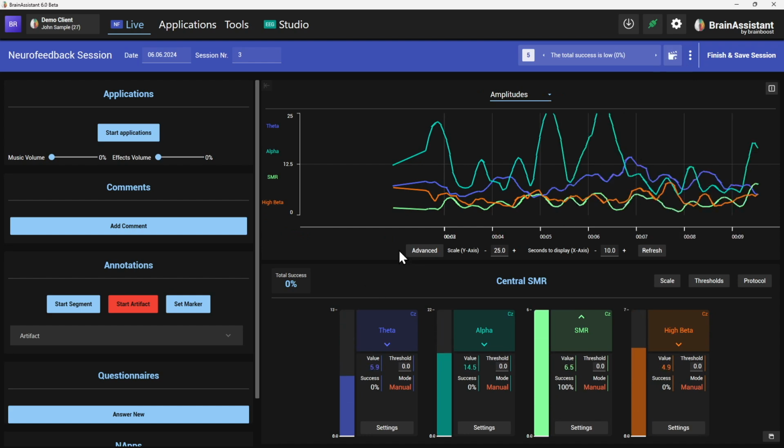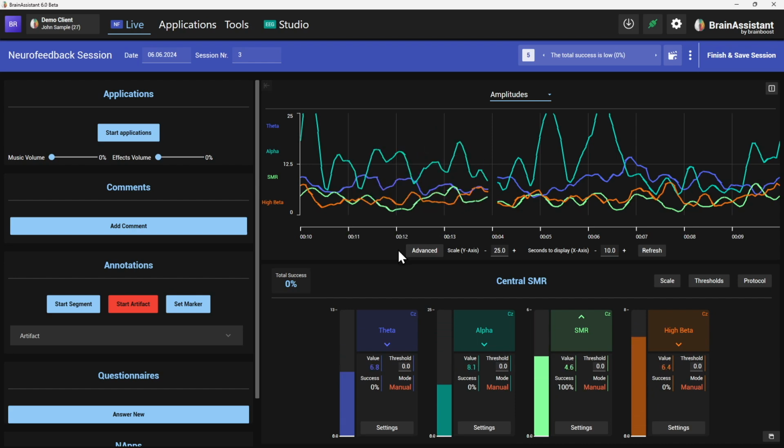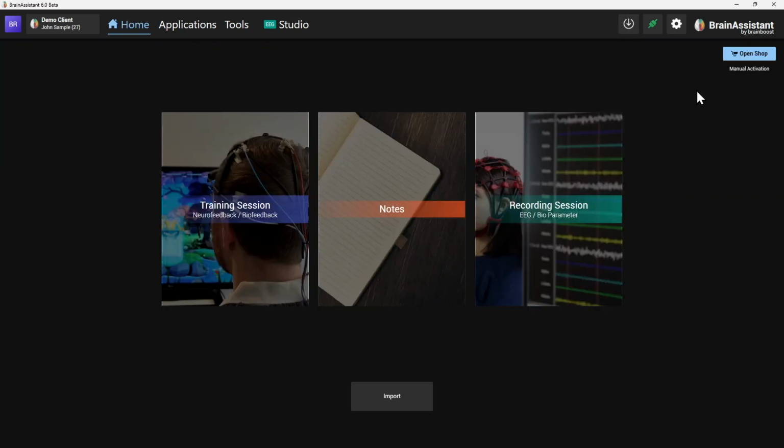So to do an auto report, as I just showed you, we need raw EEG. So you will have to record in the Nexus software, export the EDF file, and then import it here. I know, sorry for that, but we don't have that connection between the software and hardware to get the raw EEG. Another question, what if the eyes open and eyes closed are separate recording files?